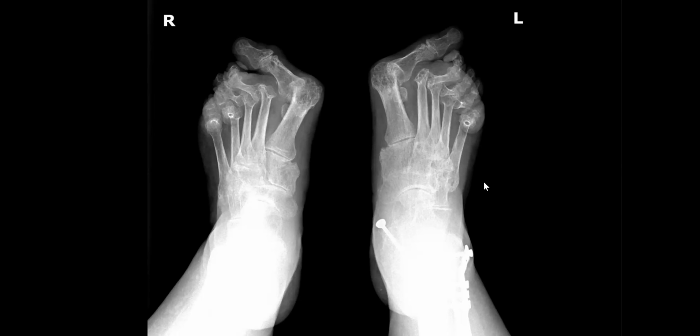What is the diagnosis? The symmetrical involvement of both metatarsophalangeal joints, so rheumatoid arthritis was the differential diagnosis. Excellent. Yes, I know it's atypical to be seen in the foot, but this is exam-wise.